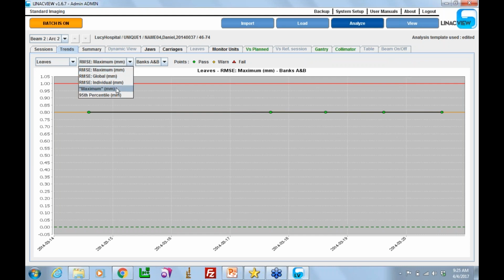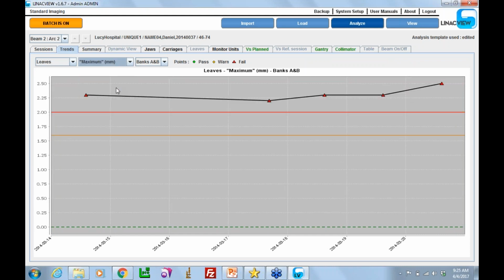Let's see. This is really the more interesting maximum, which is the biggest value. And as you can see here, the maximum errors are essentially around 2.5 or so. And remember what I had mentioned, that because of the matching, you can calculate out the worst case matching error, and the worst case is about 0.625 actually.